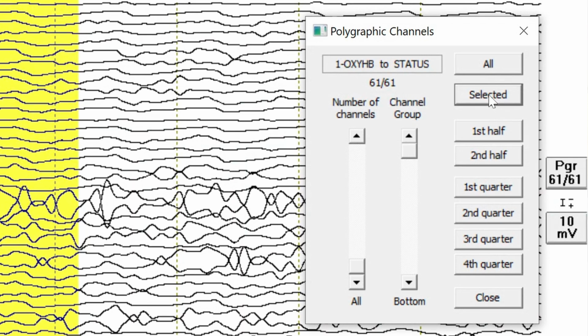It would then be called scalp channels, because after we've done the actual locations on the head and implemented an ELP file, BESA would say, okay, that's all clear, it's scalp files, and then these would show up on the head, and then you can do, of course, source analysis, all the beautiful things BESA offers, using an NIRS file. It's absolutely spot on, it's fantastic stuff. That's it for the single light NIRS file.